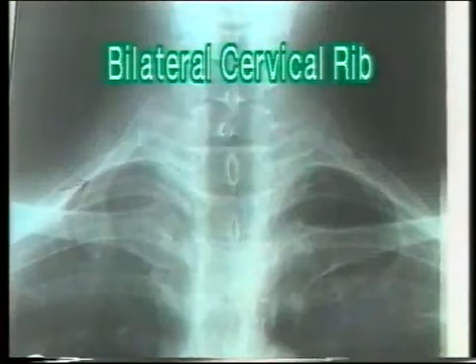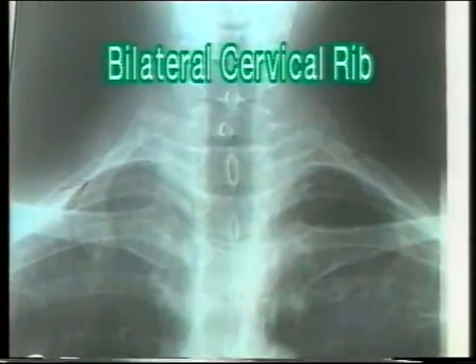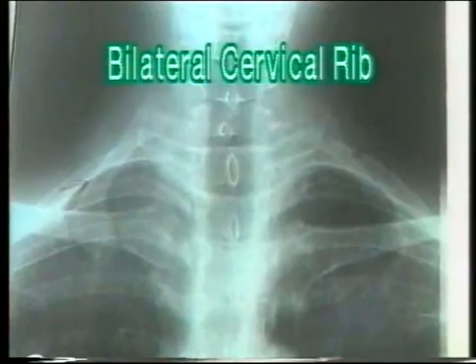To conclude, whenever apical regions of the lungs look asymmetrical, look carefully for a cervical rib. So also, when the patient has pains radiating from the neck to the arms, a cervical rib, even if very small and rudimentary, should be looked for. Trace the rib backwards and confirm that it articulates with the transverse process which slants downwards, and only then label it as a cervical rib.